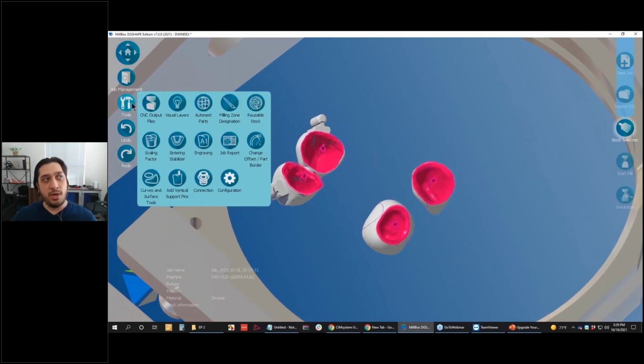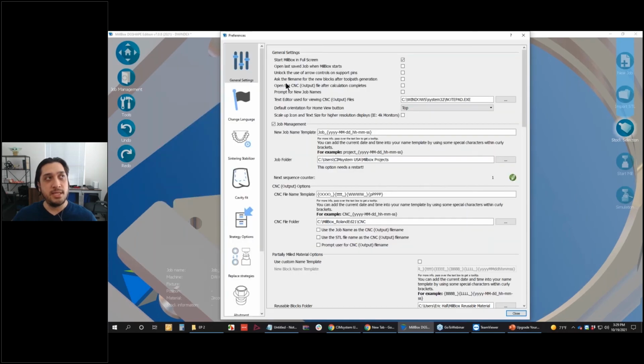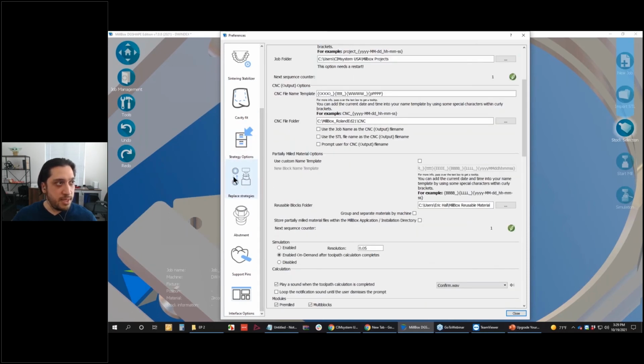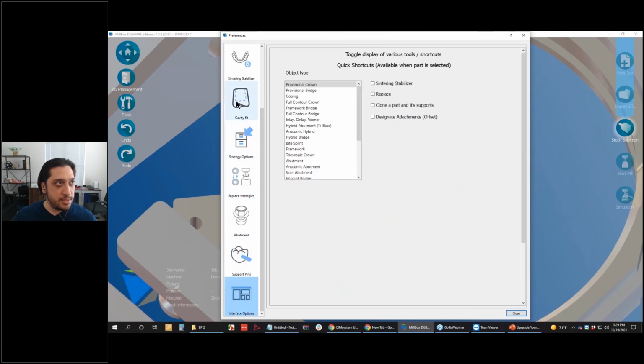So can I customize that? That was kind of the next step. Yes, you can customize that. So as long as you have access to get into your settings here, your dealer can also access your settings and assist you with this. Let's see here. Let me scroll down to where that is.